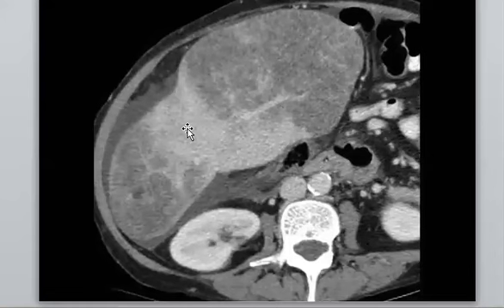In real practice, I would mention that it could be something malignant or metastatic, and your differential will include masses. But there are some helpful signs: look at the vessels, the hepatic veins, and also the appearance of the lesion. If it is a geographic area and the vessels have no mass effect and traverse clearly.